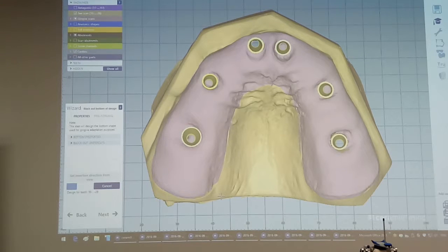You have seen at the beginning when we adjusted the teeth from the library, there was a huge distance between the teeth and the original gingiva. And this region will be filled out with zirconium in the form of the gingiva. But the natural surface we will protect with the thinnest layer.